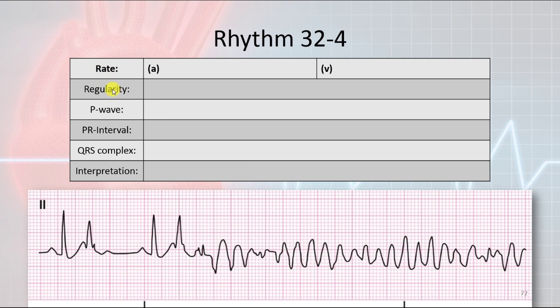On this one here, we have an atrial rate, and what's interesting is we have a P wave right here, and what we have right here looks to be an R on T PVC. There's a P wave with a sinus beat, and there's an R on T PVC. So it looks like the heart is really irritated at this point. So we have what looks to be an atrial rate at this point of 20 beats per minute.